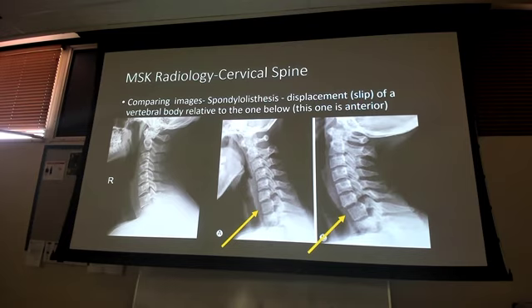So if I were to count this, I would go 1, 2, 3, 4, 5, 6, 7. So I'm involving 1, 2, 3, 4, 5, 6, 7. We involve the two vertebrae that are affected, so C6, C7, right? Because the slippage is starting with 6.